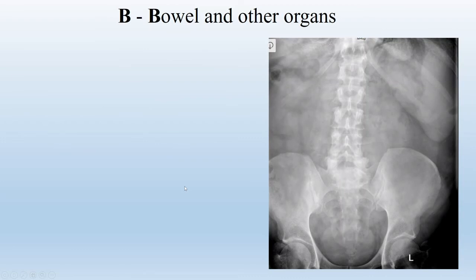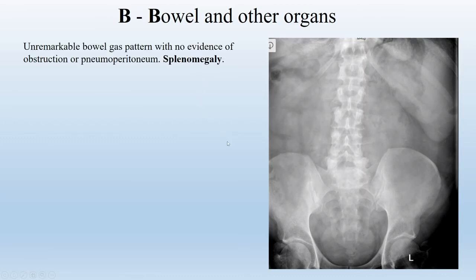Another case, assessing everything, coming up to the other organs after checking all the others. And you can see here, this is an enlarged spleen, splenomegaly.